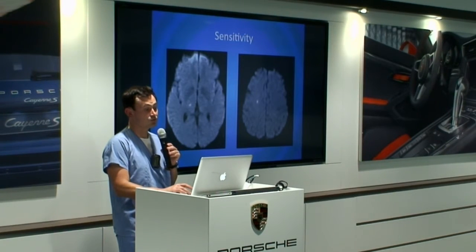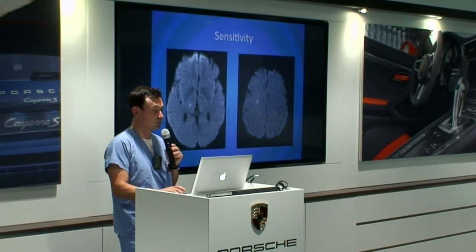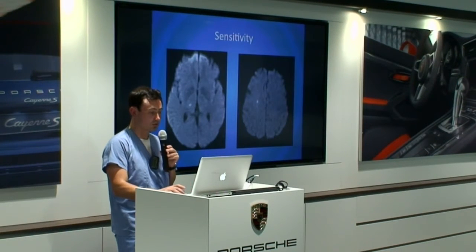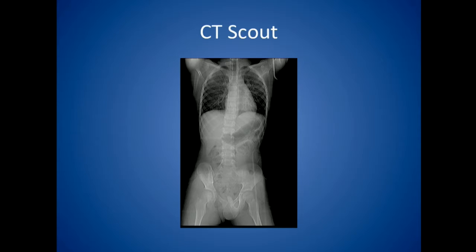And it's very sensitive, so it can actually show these tiny additional infarcts that you wouldn't really consider otherwise. You have no way of knowing that they're there because they would be clinically silent, such as this infarct in the frontal lobe.